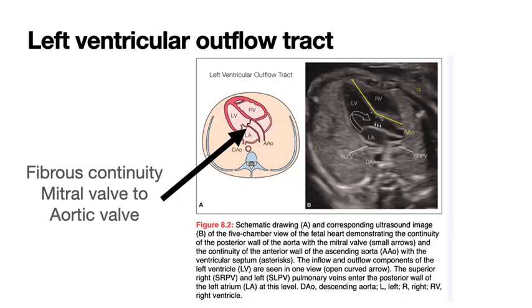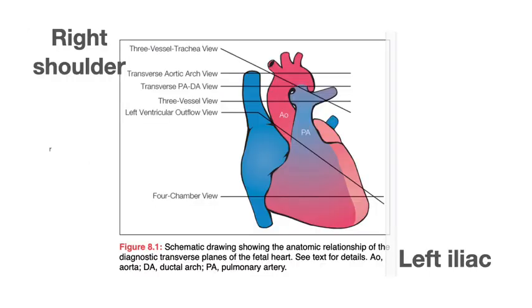All right. Well, actually, no, let's go back. The main thing to see on this slide is that pretty much the bottom view that you can get is the 4-chamber view. It is an axial view because the heart sits flat in the chest, but pretty much the bottom one that you get is the 4-chamber view.